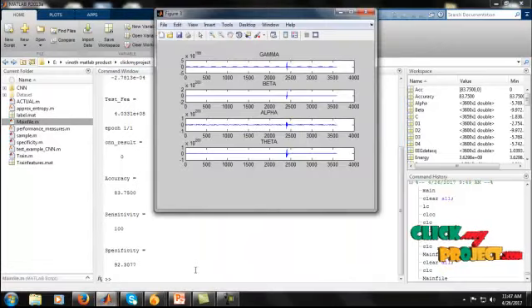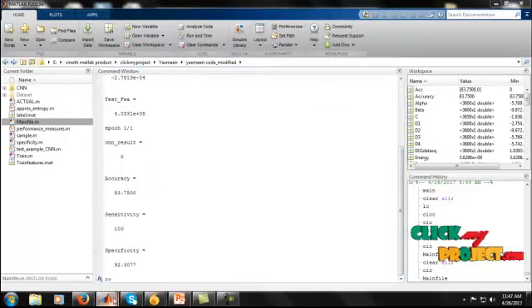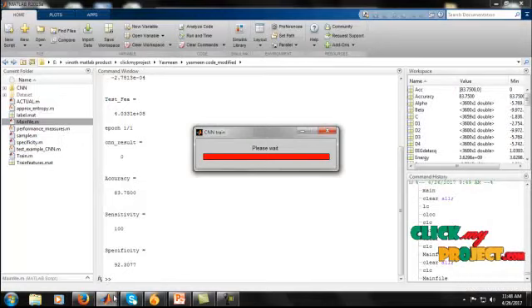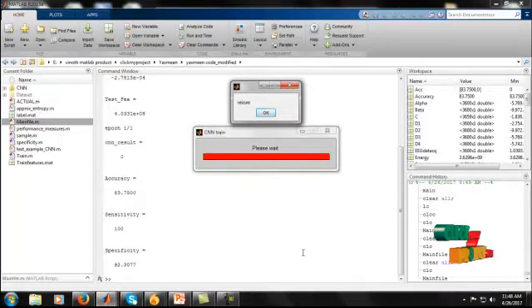Figure 3 shows when the brain signal is affected by a seizure. These are the different wavelet bands: gamma, beta, alpha and theta. They are used to analyze our seizure. After that we classify using a CNN, which means convolutional neural network. When we classify the signal, it shows that it is affected by seizure.